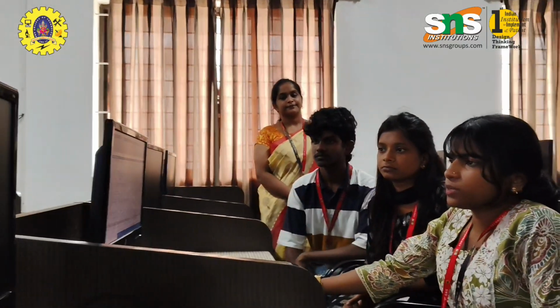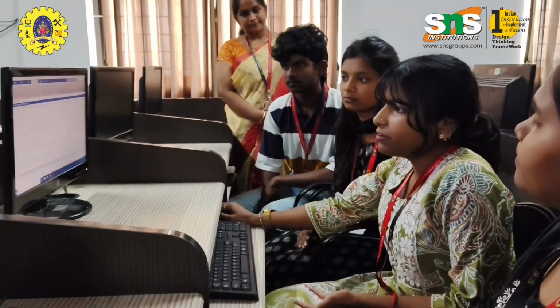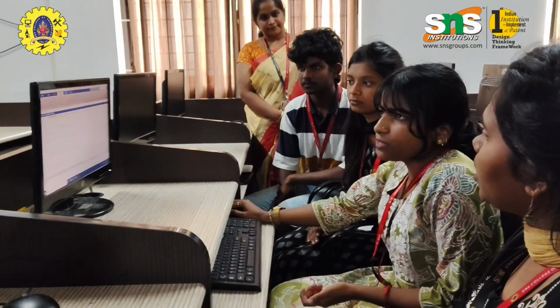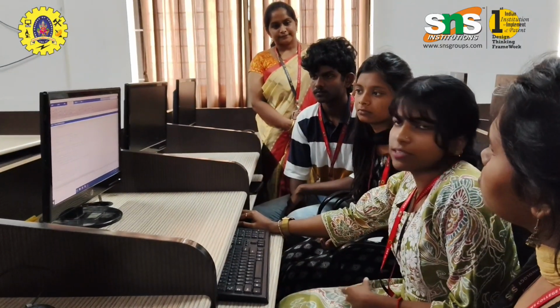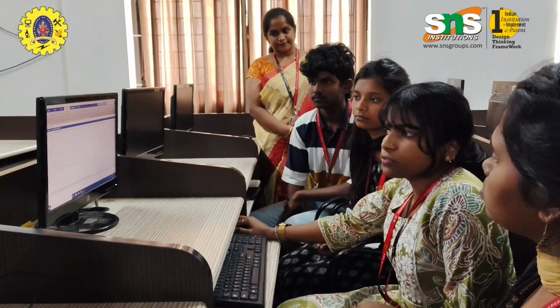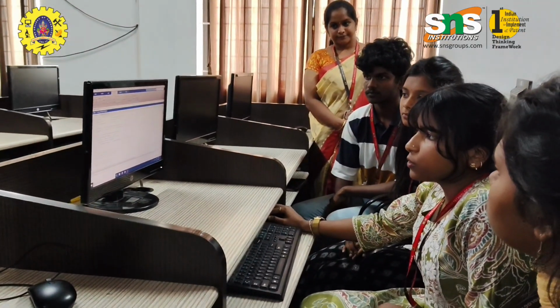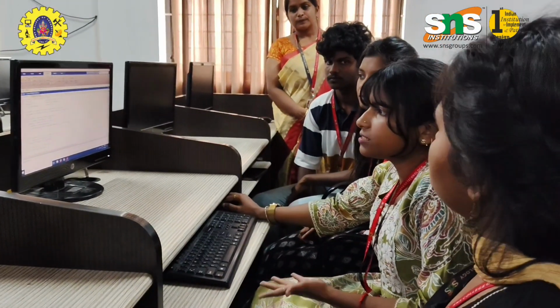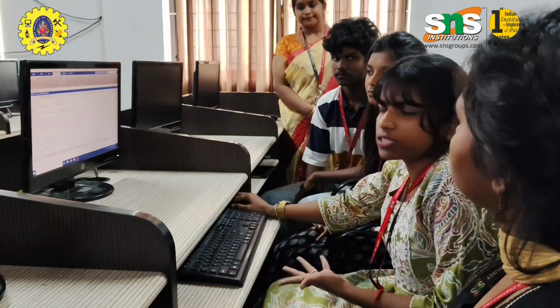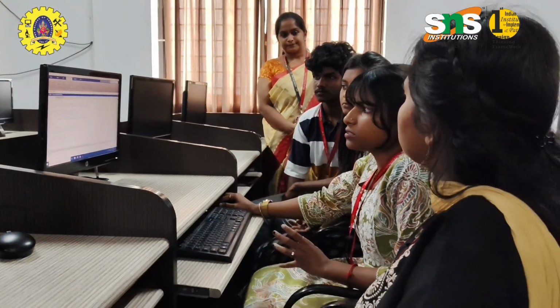Coming on to the program, our first step here is to produce a sampled ECG signal with a frequency of 360. Usually an ECG signal is produced with a frequency of 360 and a duration of 10 seconds, with the time axis varying from 0.1 to 10. Then our next step is to produce a synthetic ECG signal which has characteristics like an ECG, that is our T wave, QRS wave and P wave. And then our next step is adding random noise.